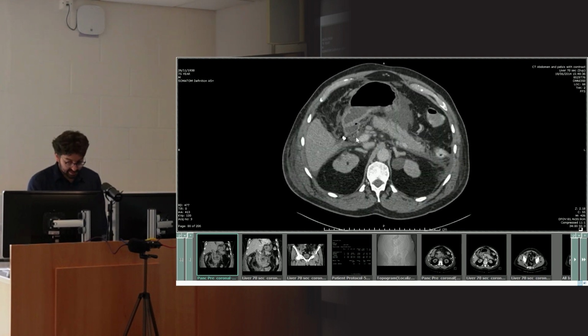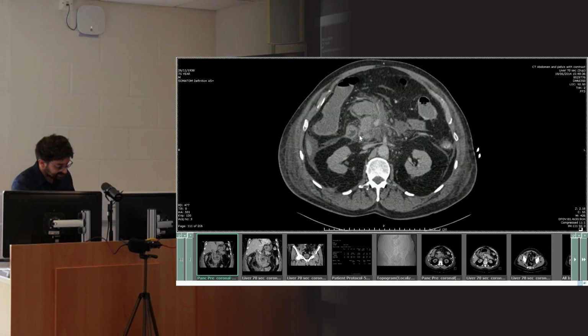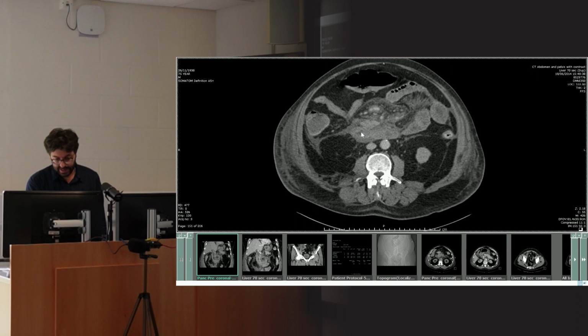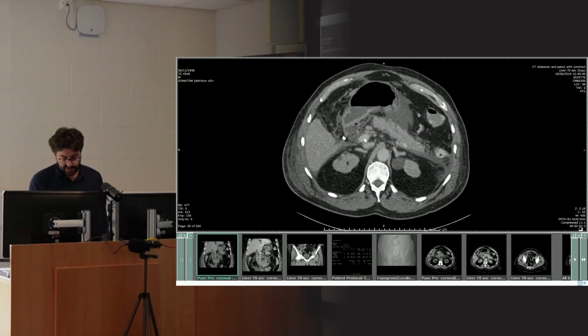So it's possible that they've got, sorry, my voice is really going. It's possible that they've got some retained stones in the bile duct. Yeah, it's possible they could have some gallstones in there. So what do we do? Well, if you're looking for stones, stones are intrinsically bright, usually, not always. Roughly about 80% of the stones you can see on CT, not all of them.